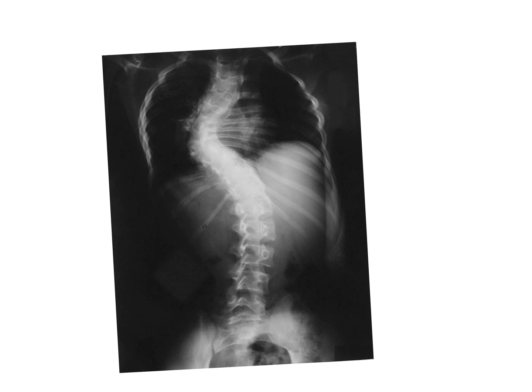One thing to remember for scoliosis is there's not only a lateral curvature, which we call this view here. If we were to ask this person to turn to their side so we could take a lateral view, we might also see some rotation, meaning that one half of the body may be naturally more anterior than the other. And just basically a twisting and a curvature, basically from anterior to posterior as well, can be associated.